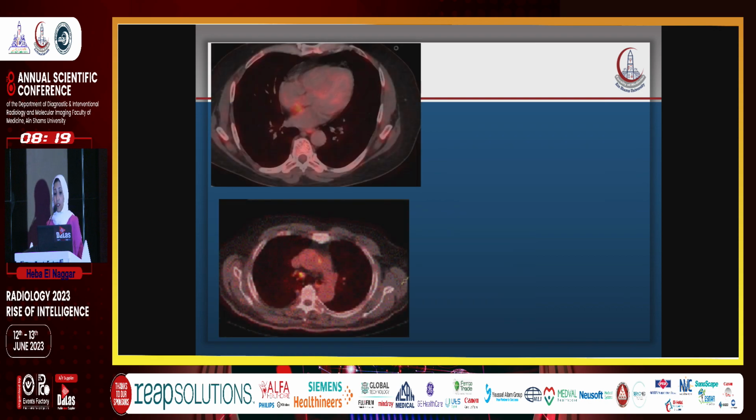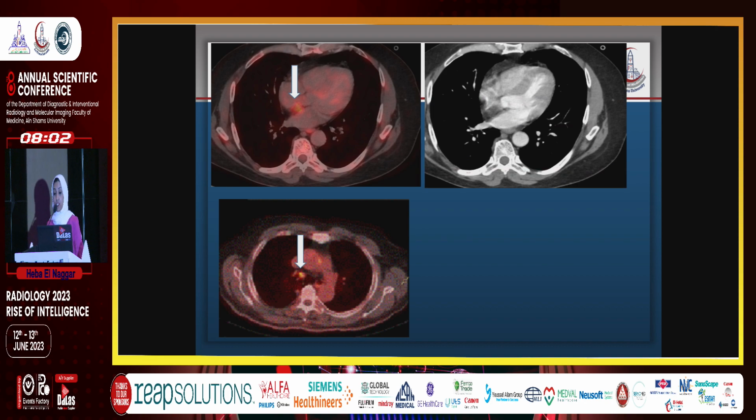We proceed to different patients with lymphoma, both referred for PET-CT assessment. In the fused images, we can see areas of abnormal FDG uptake at the mediastinum, suspicious for mediastinal lymph nodes. But look carefully at the conventional CT images. In the first case, there is no corresponding lymph node present. It is only fat density. So this is normal uptake in the epicardial fat, and it's not a pathological lymph node.